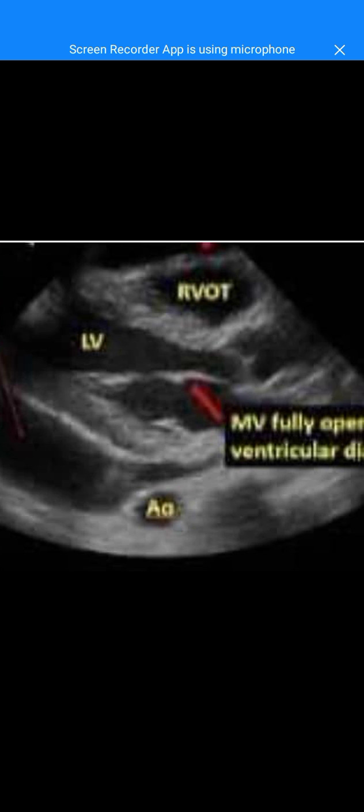Then as we move downwards, we're starting from the top to bottom, because each time we are doing an echo evaluation, we must be systematic, very systematic. Otherwise, we'll miss some certain details if we just go haphazard in our analysis of an image. So posterior to the intraventricular septum, in this long axis view, what we see is the left ventricular chamber.